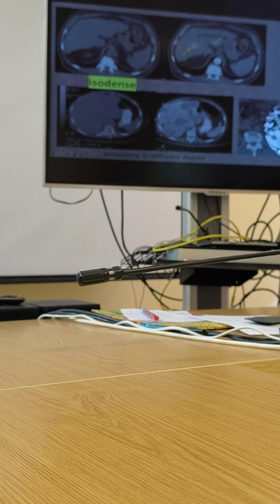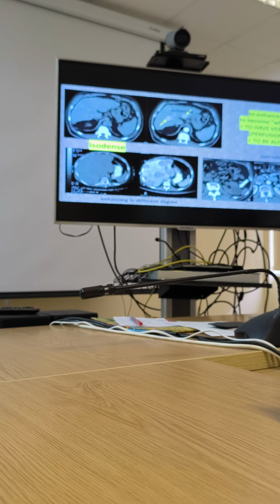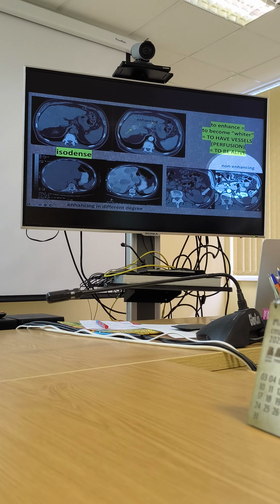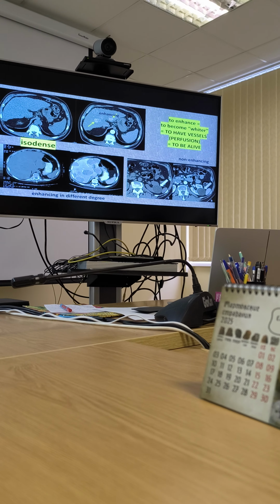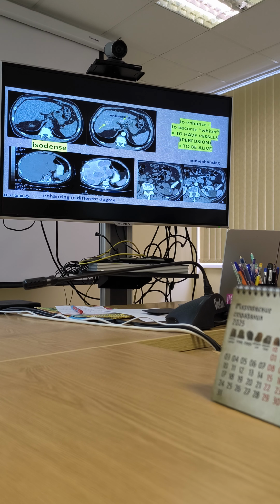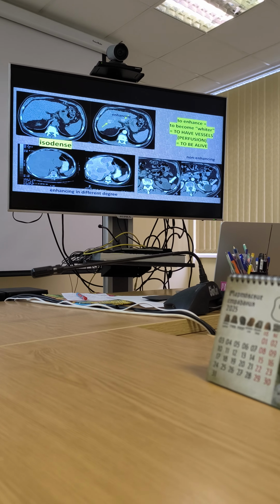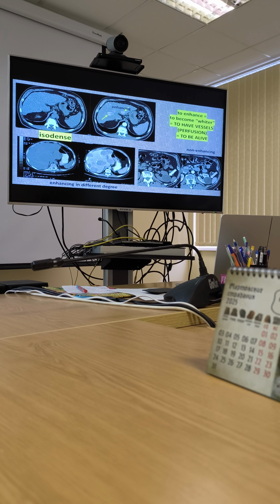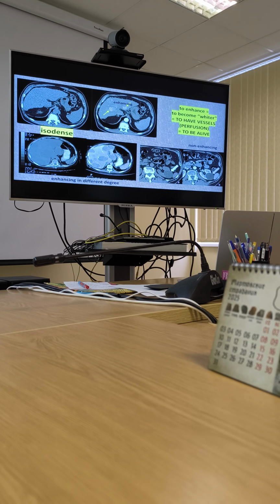So this is completely non-enhancing. That means it has no perfusion, no vessels, and if we take into account that it's a round structure, yeah, with homogeneous content, which is a medium grade color, this is something with fluid, yeah. And if it's round and in the kidney, it's most likely a cyst, yeah, filled with fluid.